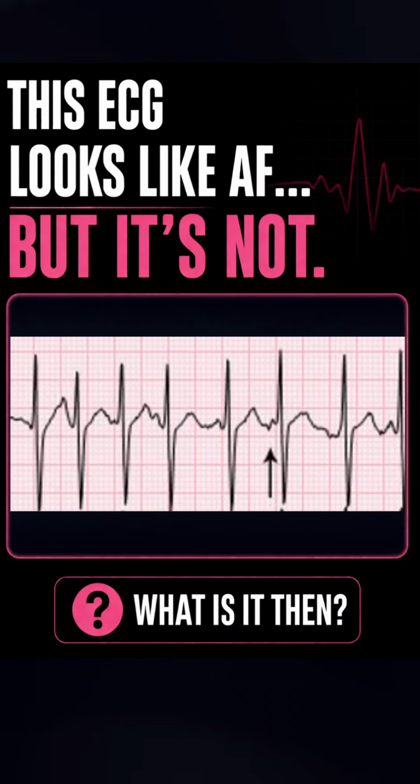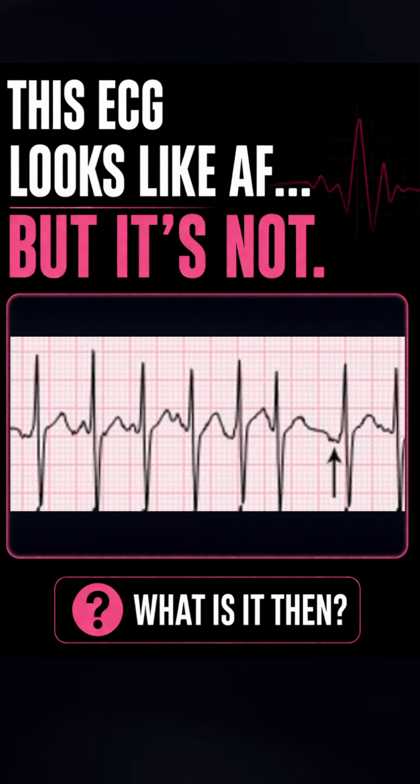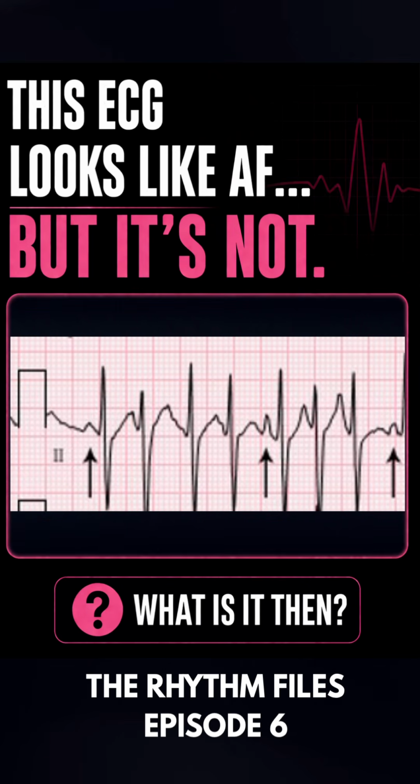This ECG looks like atrial fibrillation, but it is definitely not. If you look at the arrows that are marking the P waves, you'll notice that the P waves are a bit odd and they are non-identical. What do you think it is then?